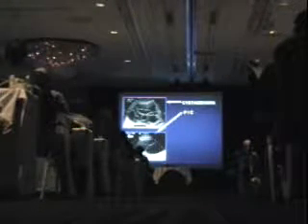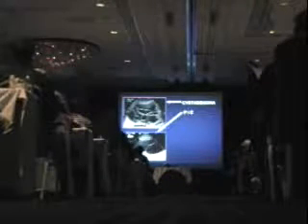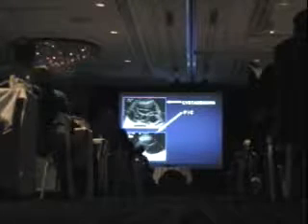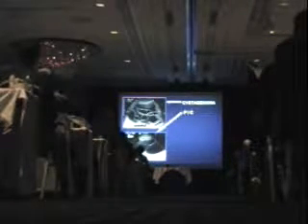I draw your attention to a couple of things here. If this was shown in its entirety, you'd appreciate that this is a roundish lesion. Tumors tend to be round or spherical. This, if you took those lines away, is much more passive, like ascites would be. And so that is an important clue.